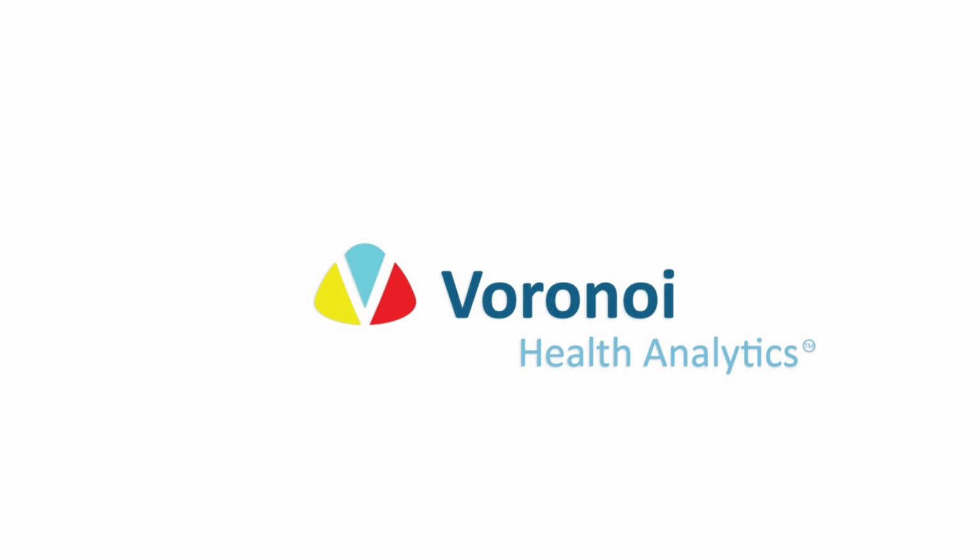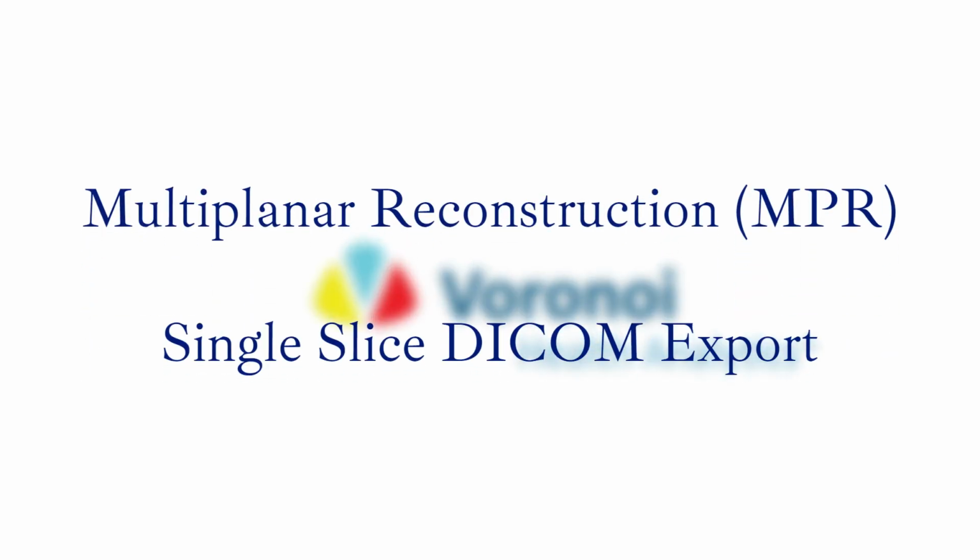Welcome to this video tutorial. We will be going over the new multi-planar reconstruction and single slice DICOM export feature in DAFS Express.